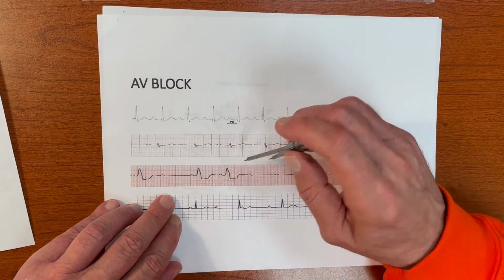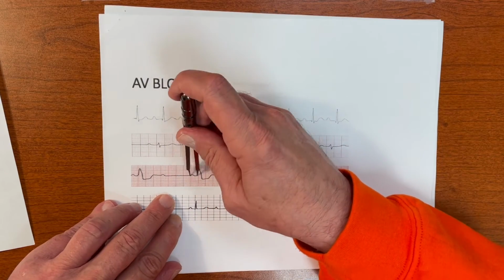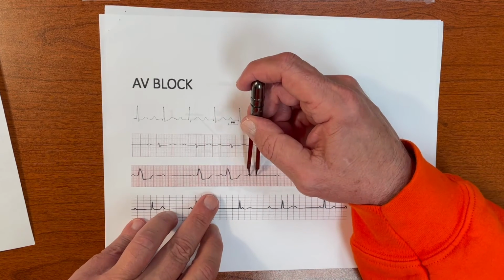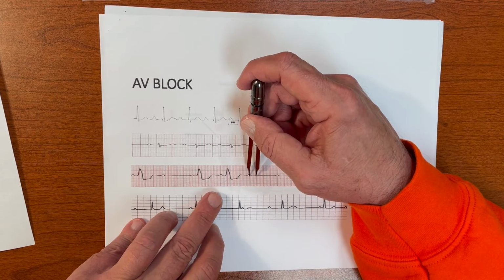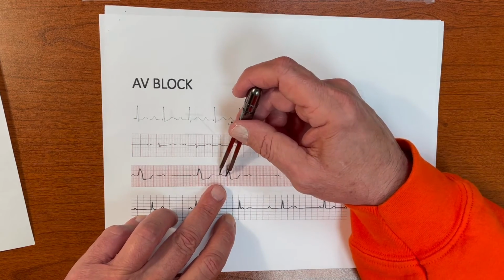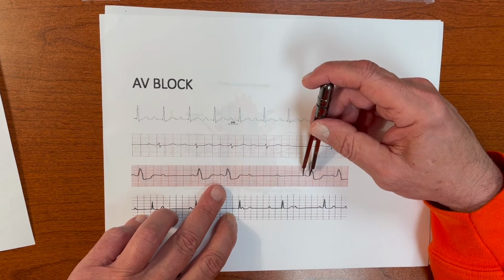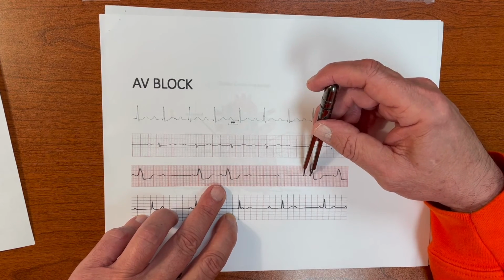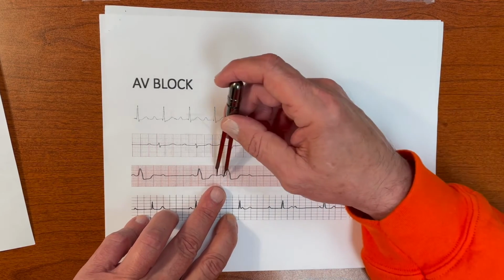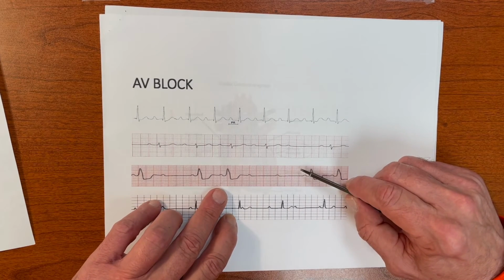Okay, these get into the ventricle. How do we know they get into the ventricle? Because I can measure their PR, and their PR is the same. But then you get a dropped beat. Well, I told you it possibly could be type 1. So we go to the PR after the pause and measure it. Notice if it was type 1, this PR interval would be shorter than this one, but instead they're identical. And this is type 2, second degree block.